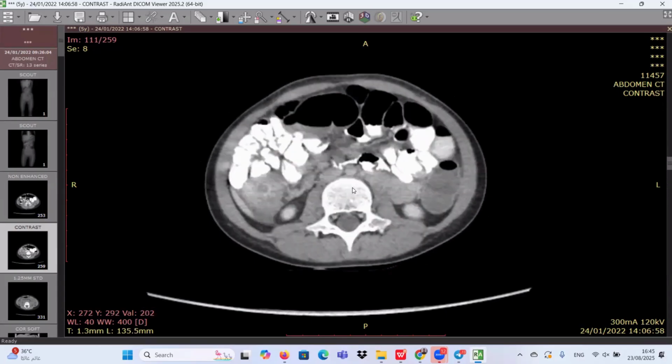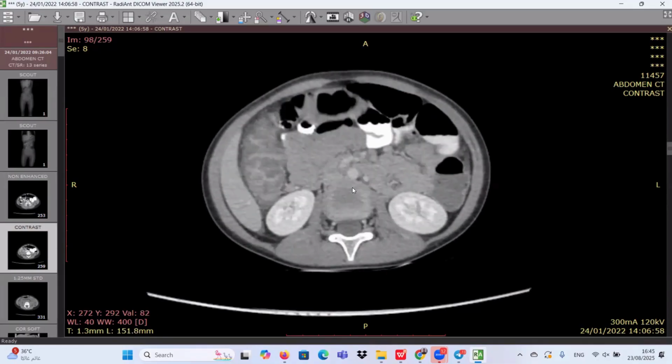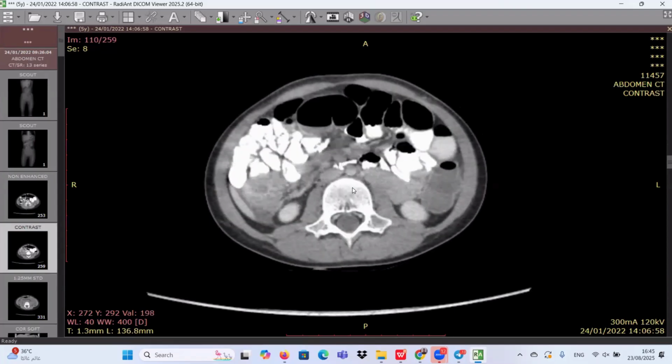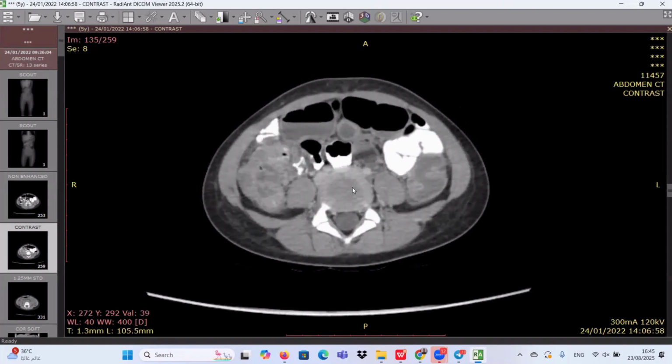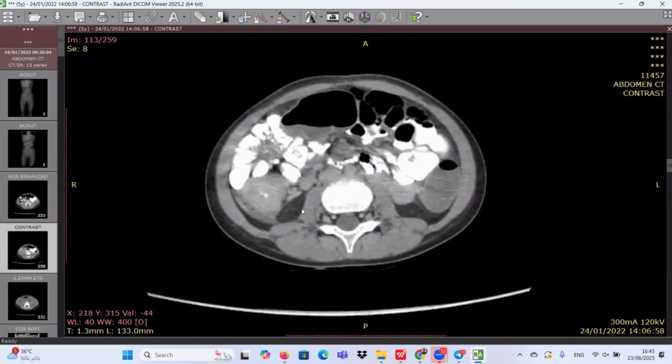Because our differential is ischemic, infection, inflammatory. I think it's difficult to be ischemic at this age group. Do you agree? Yes, sir. The mucosal enhancement pattern appears normal. There is no significant hypoenhancement. We have edema, and the mucosal enhancement is preserved.